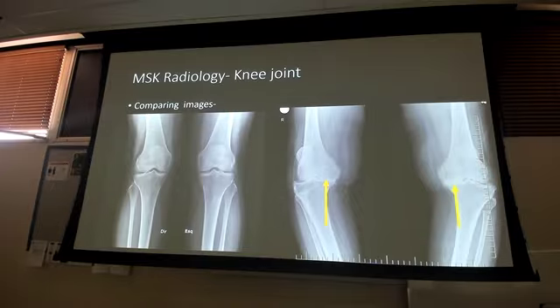Okay, what's going on here? Normal. What's going on on the other side? What do we think? What's my diagnosis? Okay, so I'm okay with that, right? So joint shortening. All right, so what are we recognizing? We're recognizing the lack of joint spacing. What was the lack of joint spacing, and what other abnormalities do we see on here?